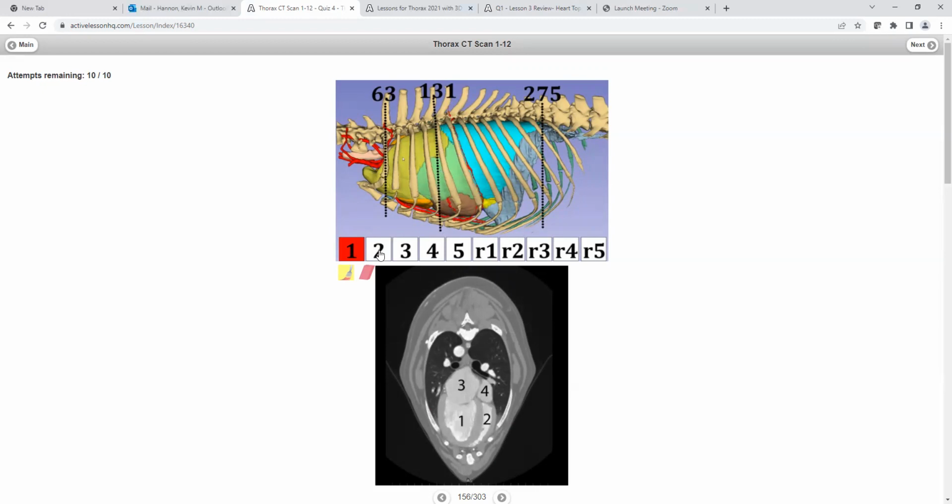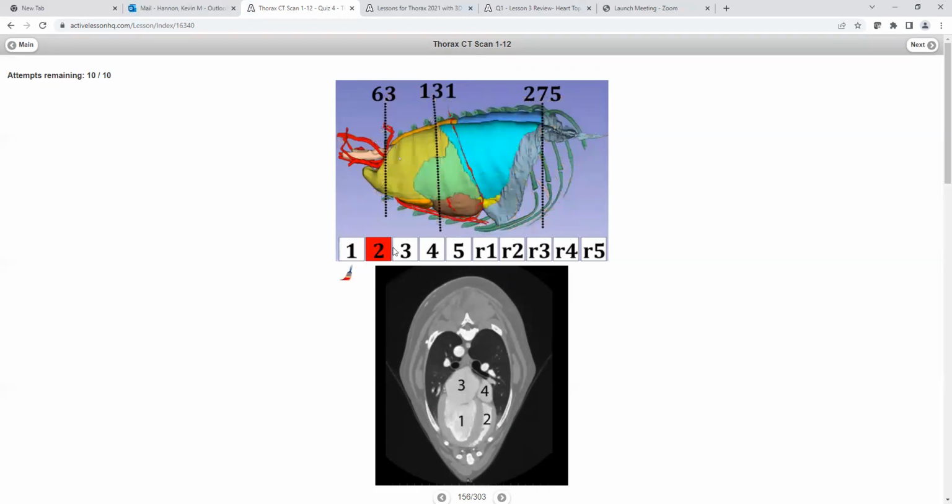These are lungs, right? And as we start to go through from superficial to deep, you're going to see lungs. As you go down through the wings, you get rid of the lungs. You're going to see things like the heart. You're going to see aorta right up in here. You're going to see lungs on the other side, etc. And this is a left lateral view, so that would represent the left side of the CT scan, which is over here on the left. And the text below told you that.